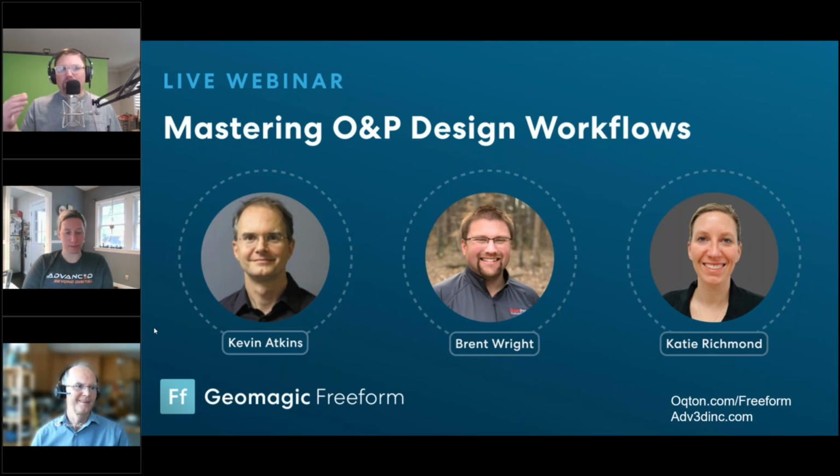But the reality is most people are not going to use Freeform Plus tools right out of the box. It just takes time in the saddle. It takes experience. So I know the sales guys probably won't love me for that, but I think that's where our goal is, Freeform Plus. But you can start with Freeform, and especially Freeform now will run Dynabots. So even though you may not be able to create a Dynabot in Freeform, you could run a Dynabot of somebody's that you like, or of something. So you don't have to have Plus to do it. Yep.